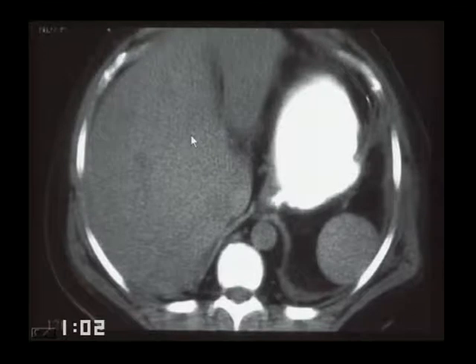This patient has had a splenectomy. But there's something over there that looks like spleen. So what is it? Well, that's hypertrophy of an accessory spleen. In patients who've had splenectomy, small unrecognized accessory spleens might hypertrophy. The patient may have had a splenectomy for various disease processes or post-traumatic, for example. It doesn't really matter. Will the hypertrophy of an accessory spleen confer immunologic competence? Probably not. It's been studied a little bit.